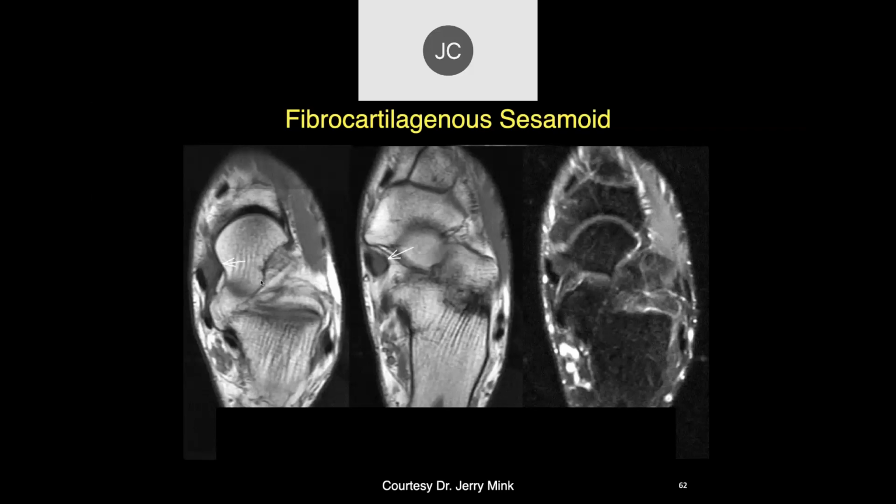This is very variable. This turns out to be fibrocartilage. It can be not prominent at all, and you have the tendon directly attached to the medial part of the navicular, or it can be a prominent thickening. It can be black, it can be gray like this, or it can be ossified.